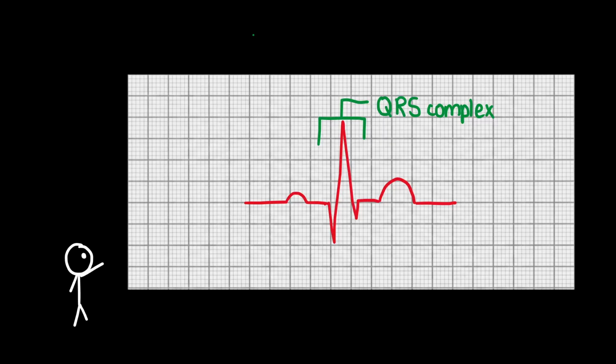And here's something worth knowing now. Not every QRS complex contains all 3 components. Sometimes the Q is absent. Sometimes the S is absent. But in the end, it's still called the QRS complex, because that's the name of the event. So, a complex equals multiple waves merged into one combined shape, and the QRS is the only one in a standard ECG.